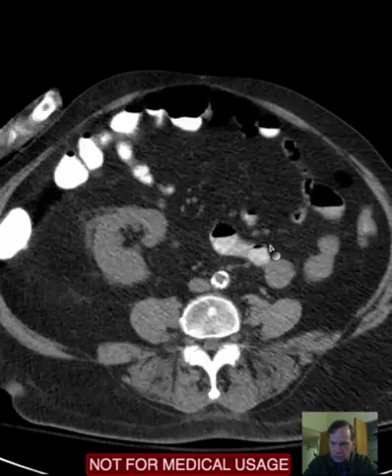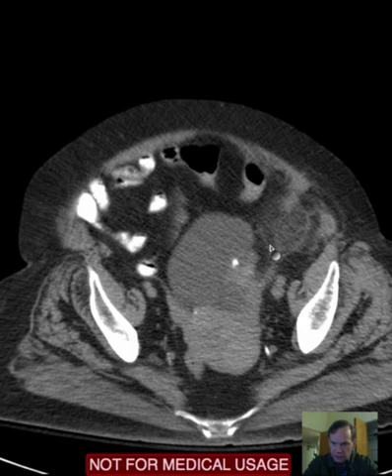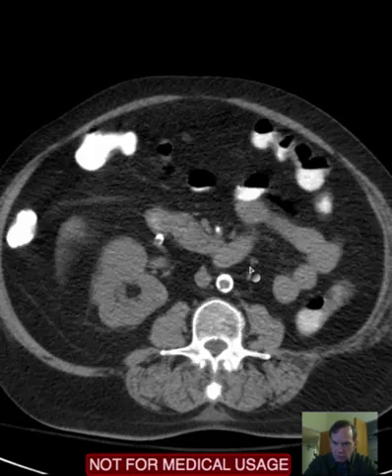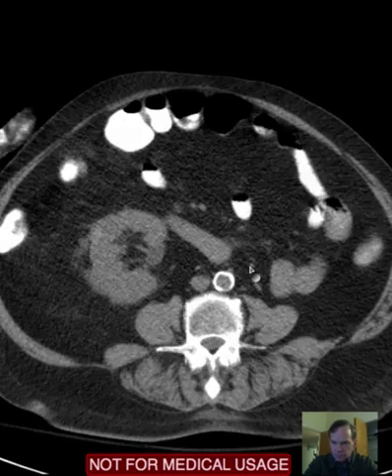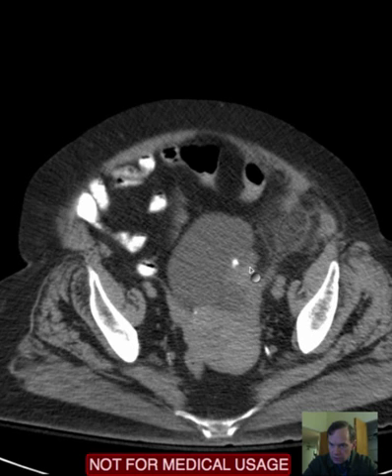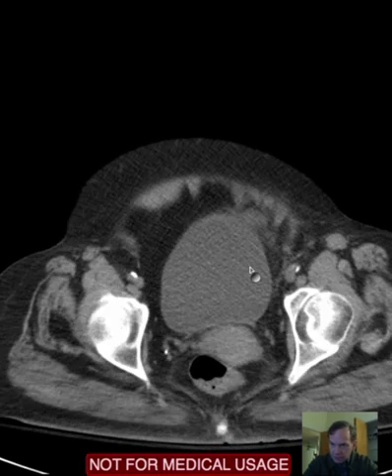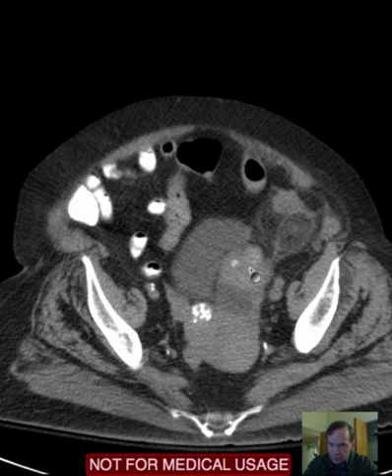So I thought it was a uterine fibroid, but it is actually a pelvic kidney because there is no kidney on the left in the abdomen. So that's what I get for having dived right into the pelvis without close examination of the abdomen.